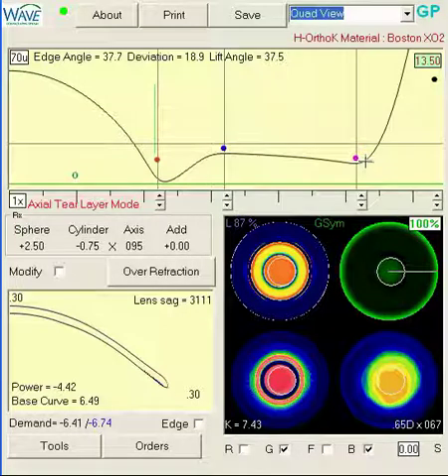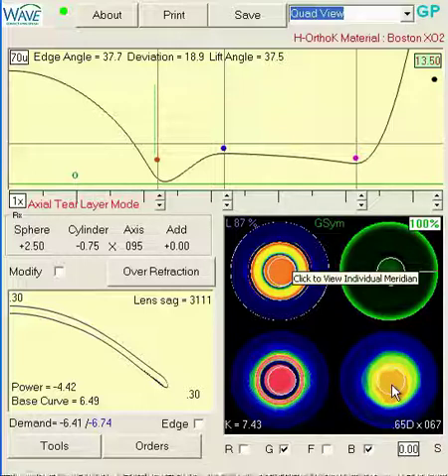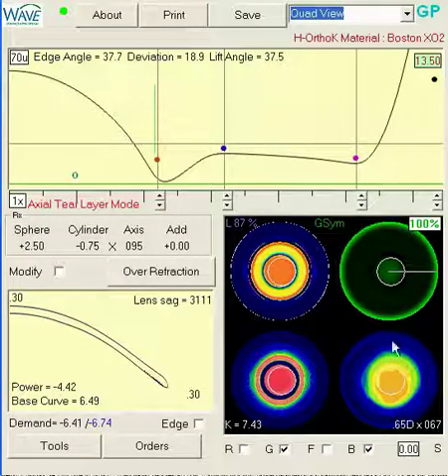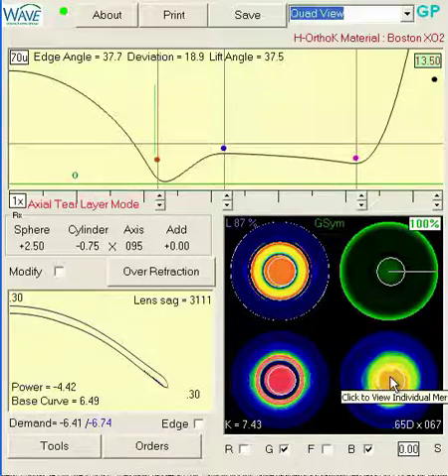As far as the edge of the lens goes, we can touch that up. The topography display shows that the corneal cap is decentered a little bit, riding a little bit low. And with a corneal lens, we'd probably expect the lens to ride low and fit right over the cap, which may or may not be good for vision. With a corneal scleral lens, the lens should center at least vertically a little bit better. And so there's going to be some asymmetry in the way the lens fits centrally.